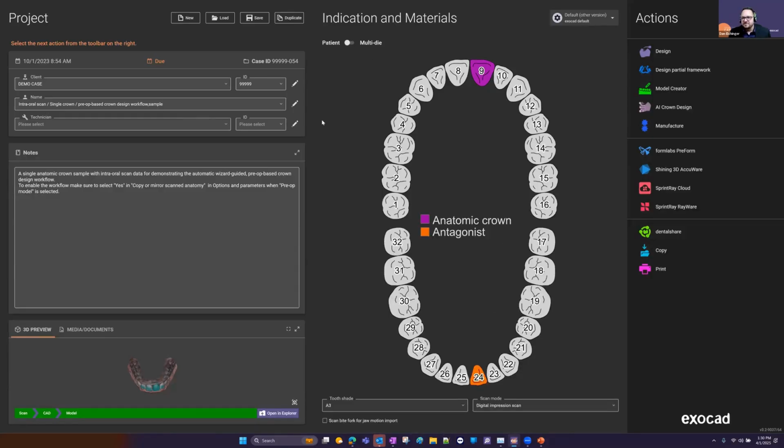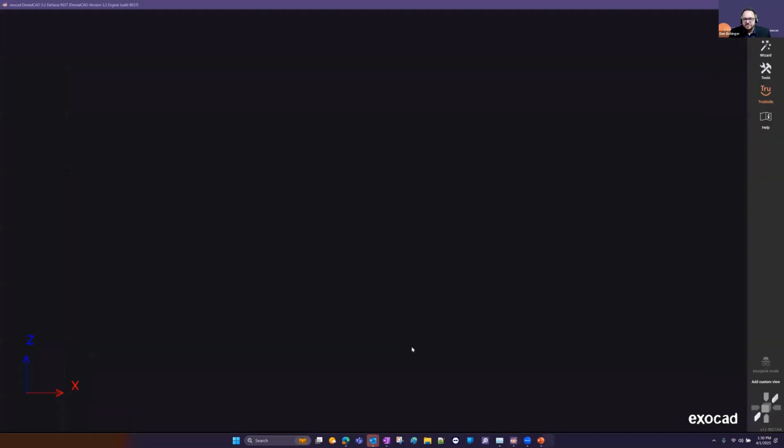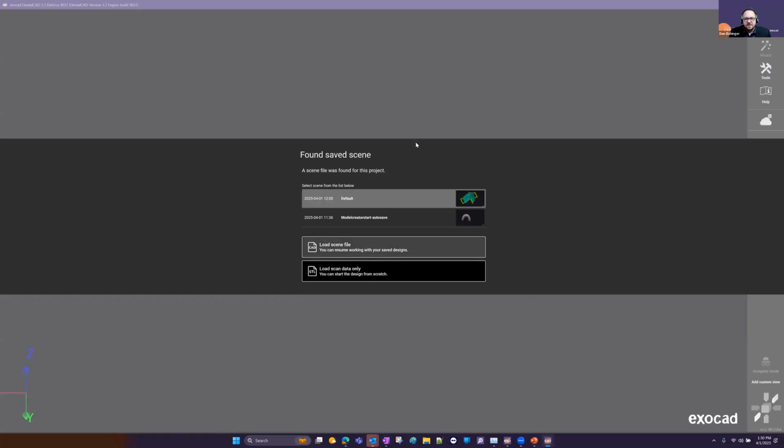So moving forward, at this point, I'm just going to launch the software and we'll go ahead and select design. Okay, so scene files. I have completed this case before, so the software recognizes scene files that I've saved. In this scenario, we're going to start from scratch.